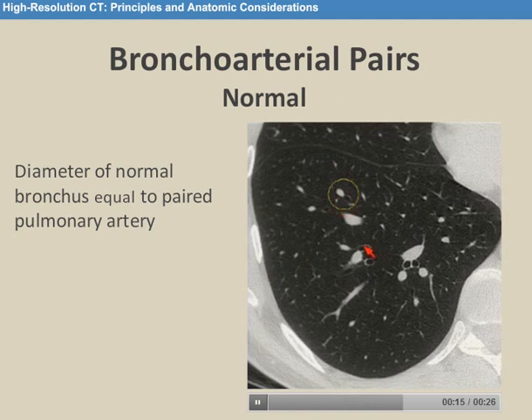And notice the very nice, discrete, thin walls of the airways we do see. Sometimes you'll see a vessel near some branching airways or vice versa. And again, you can make the comparison there by looking above and below these levels.